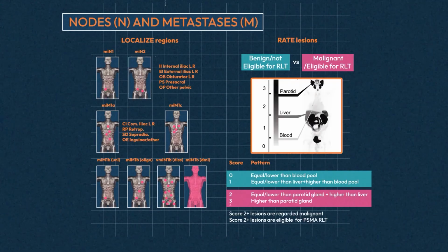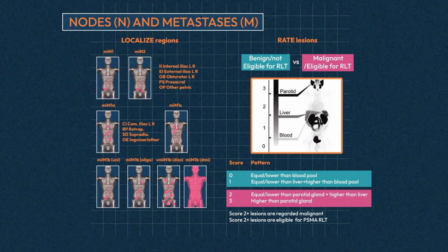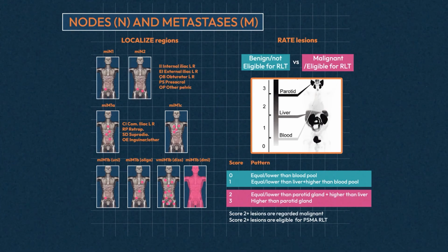The interpretation of the PSMA PET scan outside the prostate is then along the lines of the traditional TNM staging, so looking at uptake within regional lymph nodes as well as extrapelvic lymph nodes and bone and viscera, and then using that pattern of PSMA PET detection, you can then assign a molecular stage, a molecular N stage, a molecular M stage.